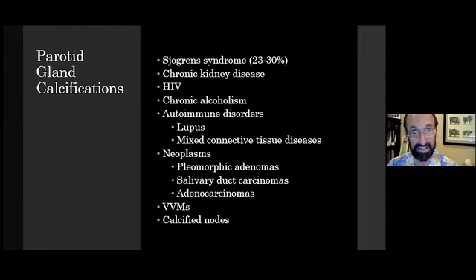In the sinuses, bright on T1 may be due to the high protein. So we go back to Peter Som's diagram. You see bright on T1 on the basis of high protein concentration at that 20 to 30% range, where it's bright on T1 and it may be either bright or dark on T2, depending upon how high the protein concentration is.